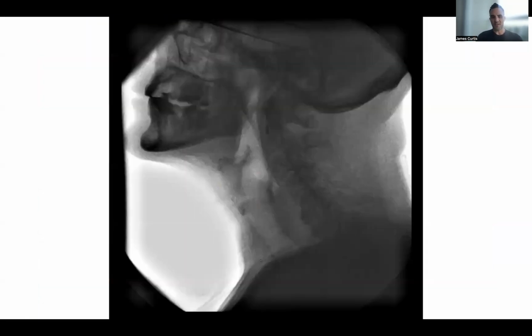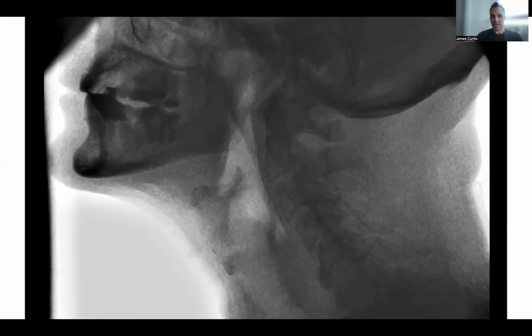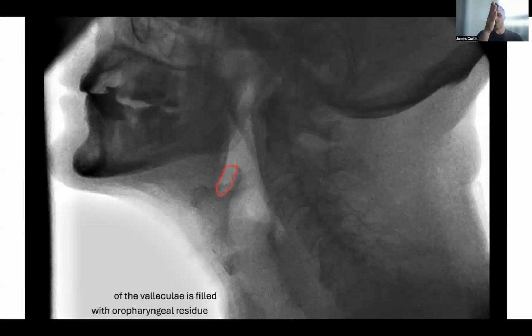I'm going to do one more landmark. I'm going to skip the hypopharynx, but instead I'm just going to do the oropharynx. And for this one, I'm going to switch our view to a videofluoroscopic view just so we can see that height in a little bit more detail. It's a little bit easier for me to outline for this. In this example, we have to think about what our boundary is for the oropharynx, and contained within the oropharynx would be the vallecula, and what's that boundary. So if we think about just the vallecula, this would extend from the base of tongue, lingual surface of the epiglottis, to the rim of the epiglottis, which is where the laryngeal and lingual surfaces meet. So this is our boundary of the vallecula.